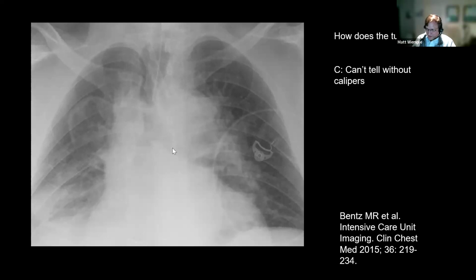I'll also say that it's pretty hard sometimes to actually see where this carina is in the trachea. So that's something where you might have to play with the brightness or the contrast basically until you can spot this.